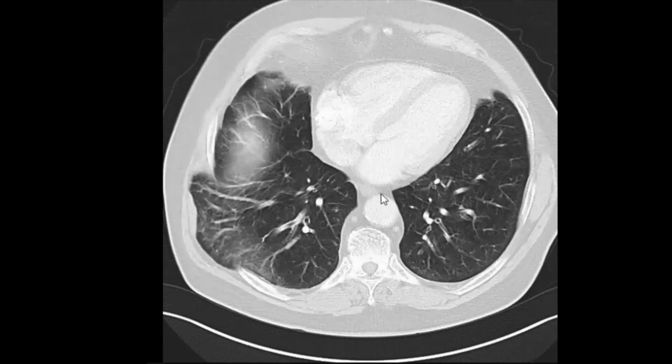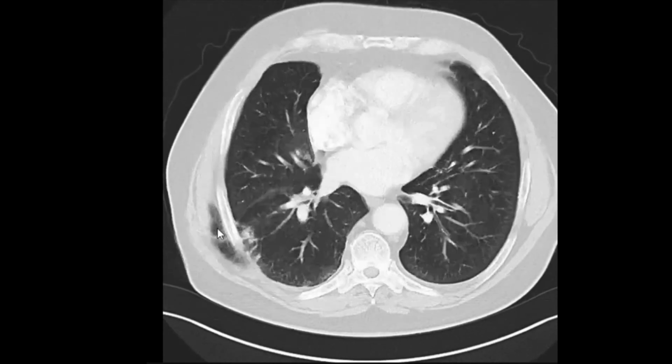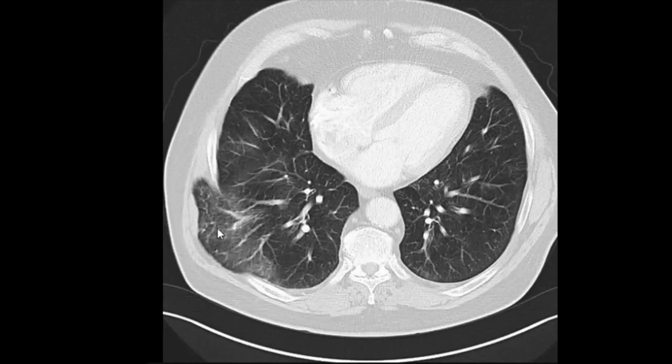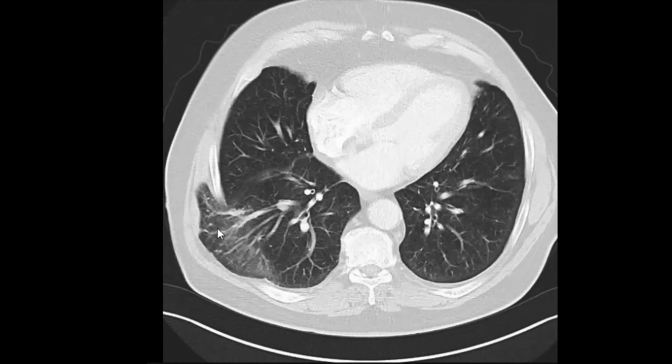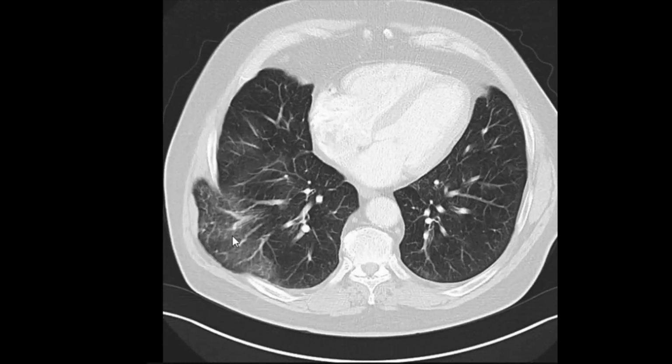Our next case was this finding over here, and this is an example of lung herniation through the intercostal muscles. Now, this could be an acute finding, or it could be a non-acute finding. The concern here, not so much in this one because it's such a wide neck, but if the neck is a little smaller, then there is a potential for herniated lung to become incarcerated and eventually strangulated and infarct.